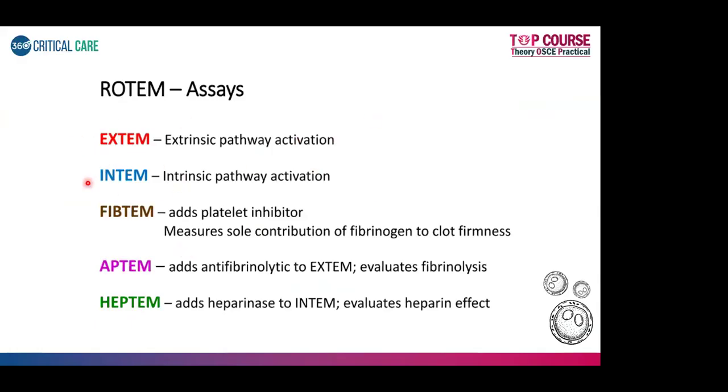Intrinsic pathway issues, INTEM. In INTEM, if there is any abnormality, like your green line is too long, it is INTEM. So usually the issue is with your clotting factors. And if after these two things are problematic, you have to look at the subsequent one. So if it's a post-operative patient with heparin, first what will you see? Heparin makes what abnormality when you give it? If you do APTT, it will be prolonged, right? "INTEM, sir." Okay, good. INTEM you'll see first.